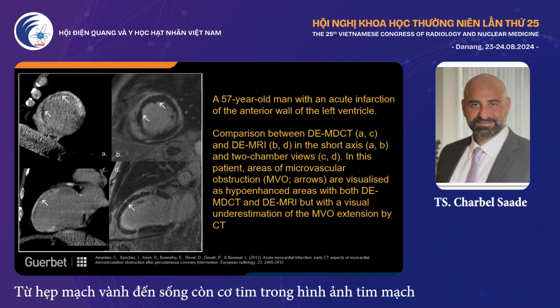Here is a case. Now, I want to also touch on CT perfusion versus cardiac MRI perfusion, or LGE. This is an interesting case.